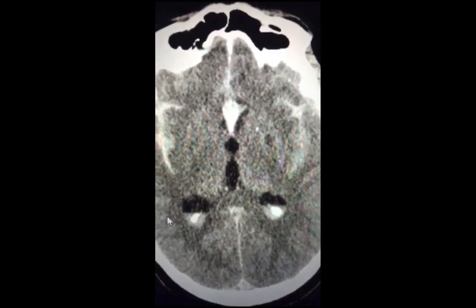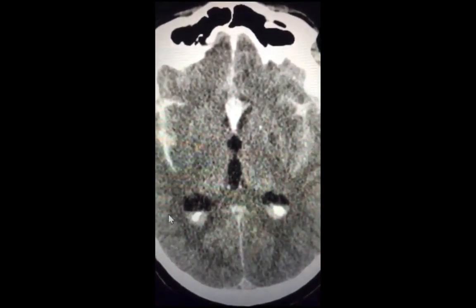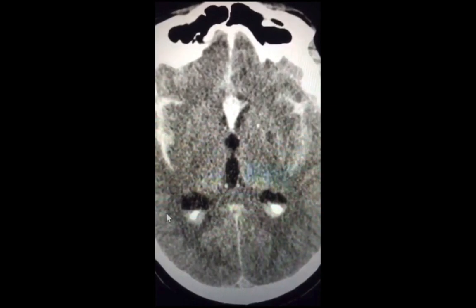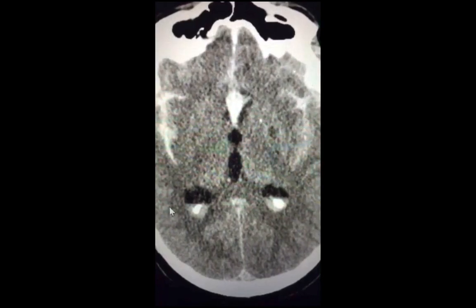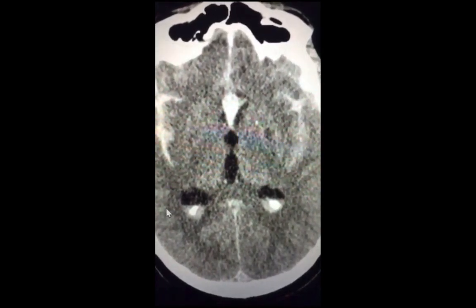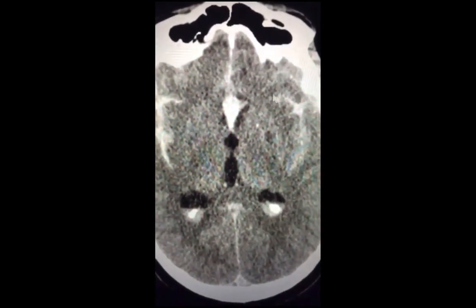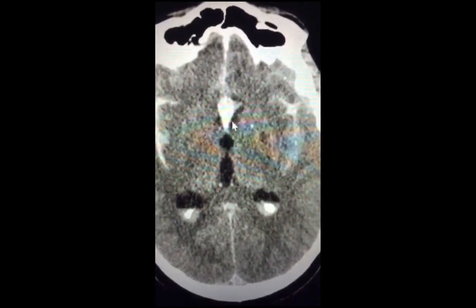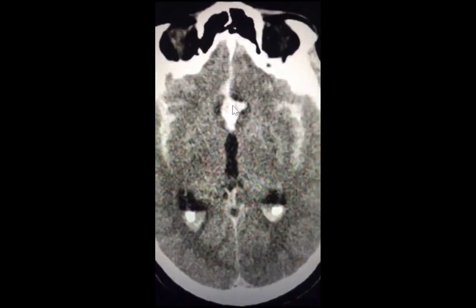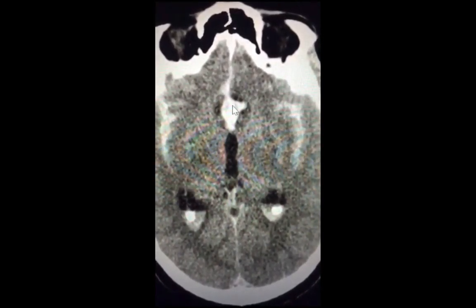What we learned from this case is that when you hear the worst headache ever or the thunderclap headache, think about subarachnoid hemorrhage. Hemorrhage anywhere could be classified into traumatic and non-traumatic, and the commonest reason for subarachnoid hemorrhage is non-traumatic. In particular, when you see a non-traumatic subarachnoid hemorrhage, the commonest thing to look for would be an aneurysm. We've also seen a very neat sentinel clot sign, which tells you that the hemorrhage is likely arising from this area. And this was actually confirmed on the CT cerebral angiogram as an anterior communicating aneurysm.